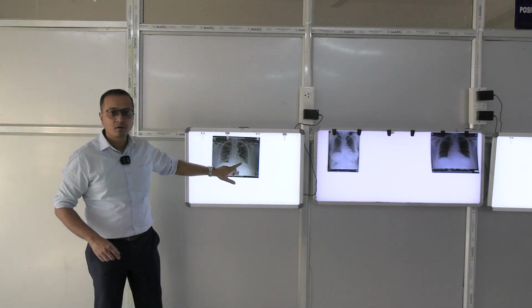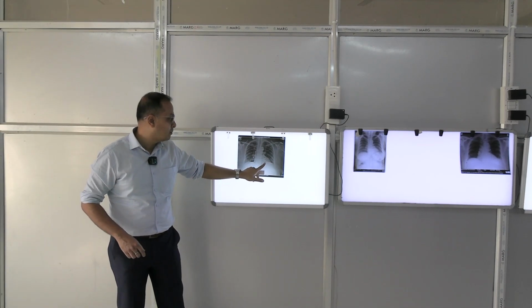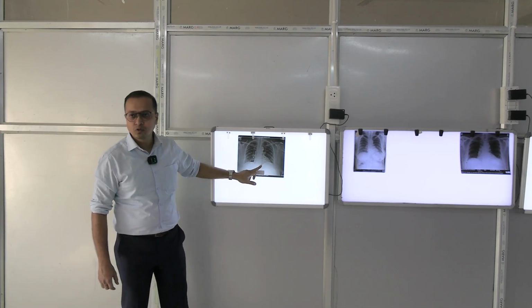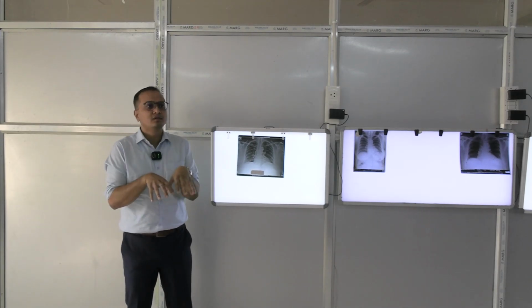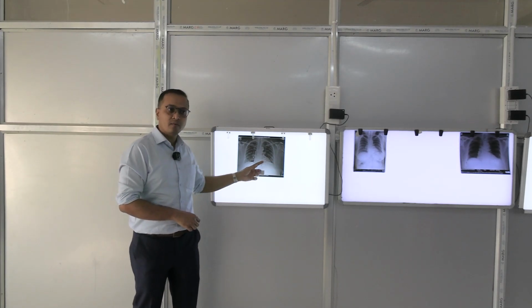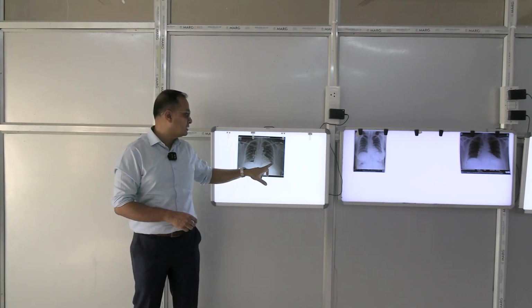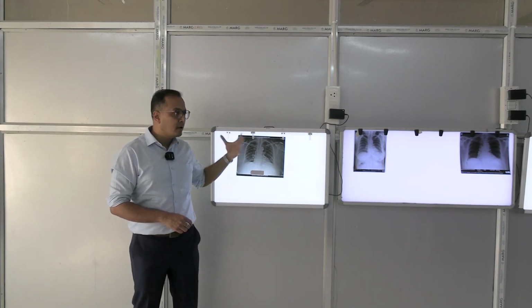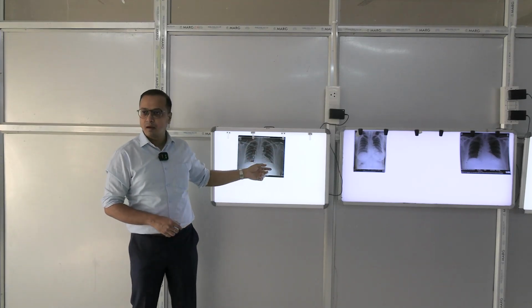Coming to these margins over here, the lung is sitting on these shadows. This lower inferior margin you can trace like this. This inferior margin also indicates the presence of some other structure. What structure is present under the lung, on which the lung is sitting? The domes of the diaphragm. So, you will be tracing these domes of the diaphragm, and the diaphragm is also visible at the inferior margin. You see whether these margins are regular or irregular; normally they should be round and regular. If there is irregularity, that will be some abnormality. So, the regularity of the domes of the diaphragm needs to be addressed.